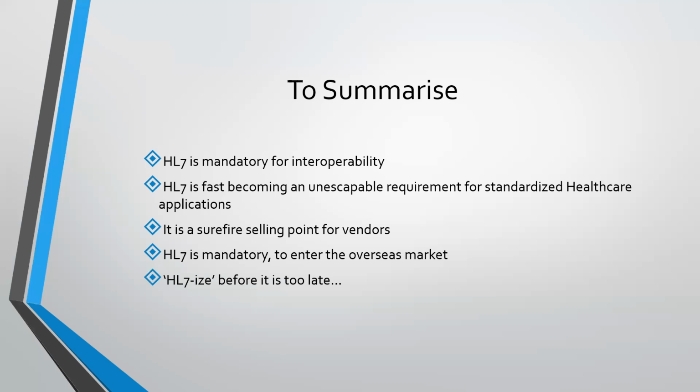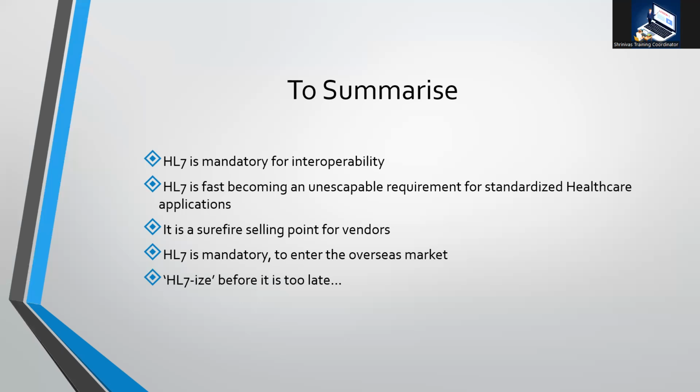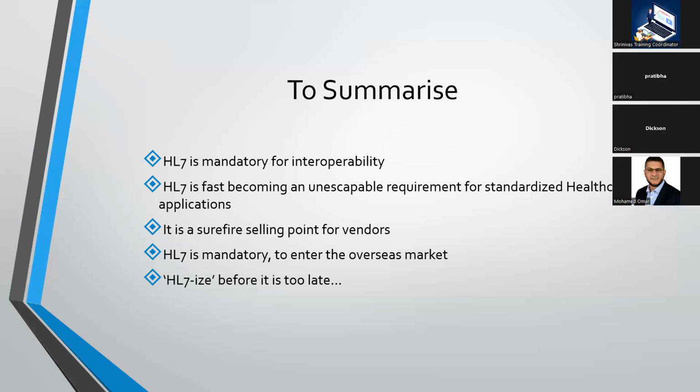Are you using any specific EHR? Good question. So we are not going to use an EHR application. All right. So, to answer your question, we are not going to use any specific EHR application, but we'll be using an EHR DB.